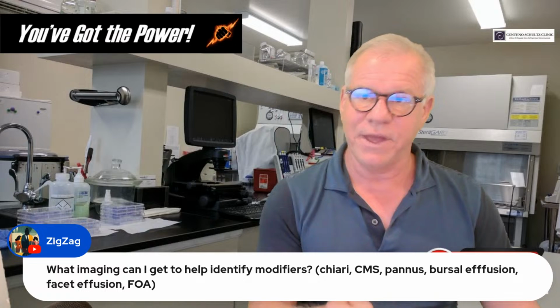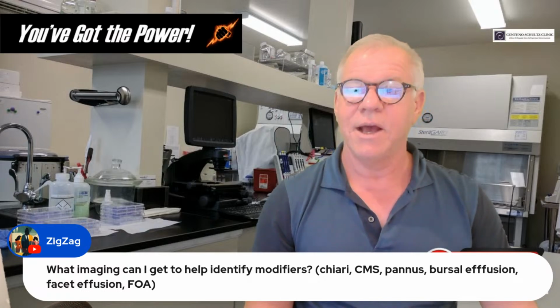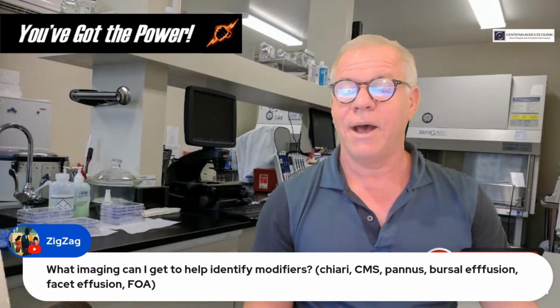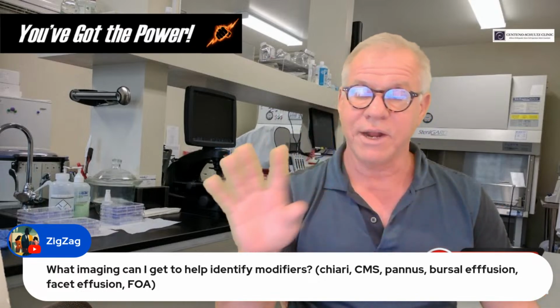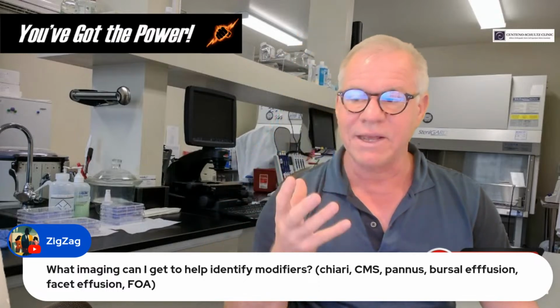And you've got to be careful there, because you want to make sure that that upright MRI is high quality. What you're usually sacrificing in an upright MRI is quality of imaging. So you want to make sure that you're threading that needle so that you've got good image quality on the upright MRI, but you're getting the benefits of upright MRI, which would be the gravity loading effect.